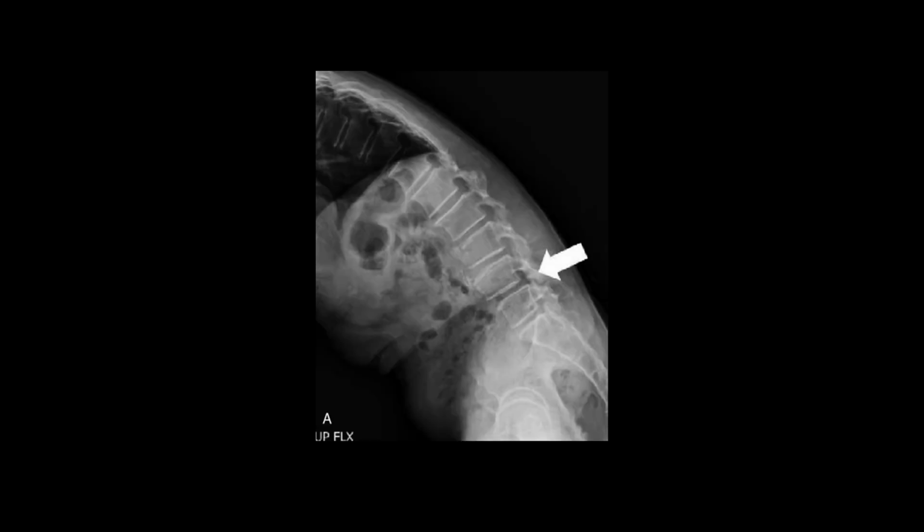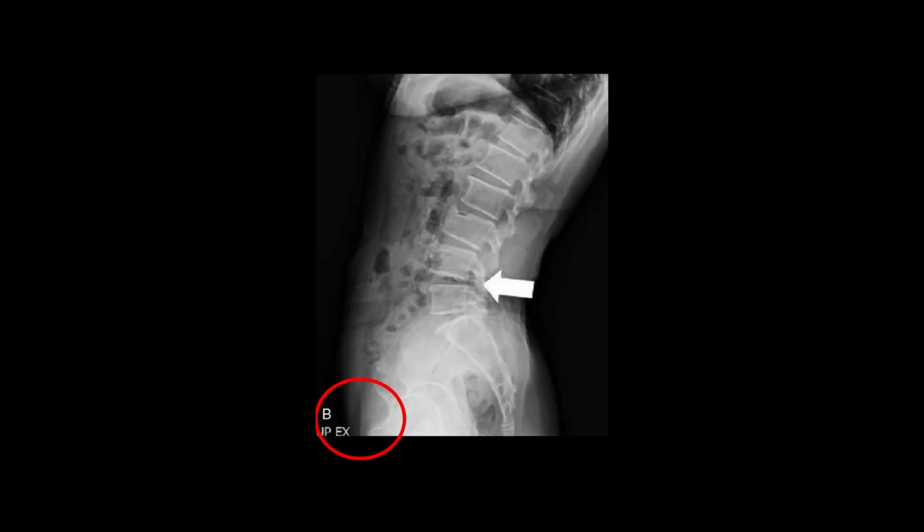Sometimes the vertebrae behave very well in neutral spine and do not show any shift or instability. So, to challenge the vertebrae and the ligaments surrounding it, the clinician may ask the person to take an X-ray in the lateral view in flexion as well as in extension.